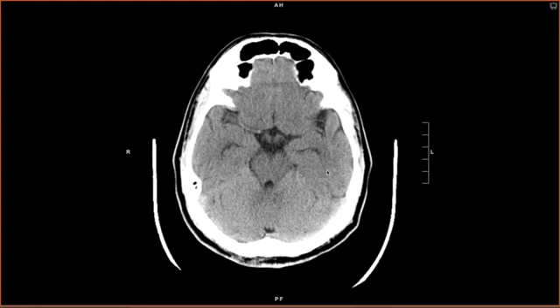So I know that was a lot of information, especially if this is new for you. If you're not going into radiology, this is more than enough for now. Watch this as many times as you need to. Don't bog yourself down with too many names. If you keep looking at CT scans, you're going to pick up things as you go along.